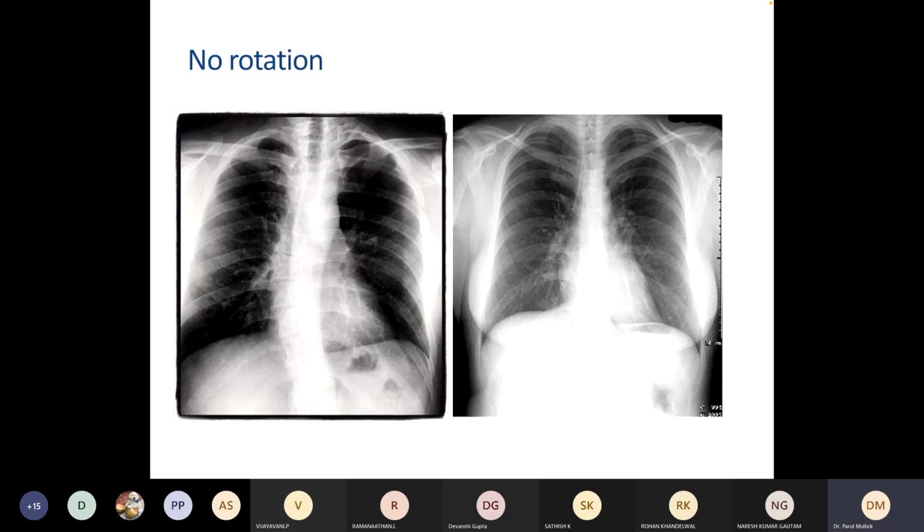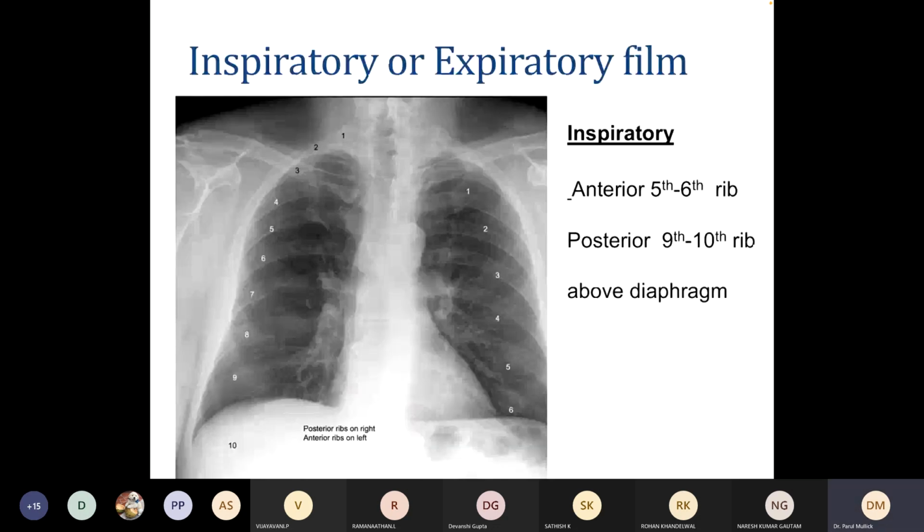Okay, now in this film you see, इस फिल्म में ये ऐसे appear तो rotated सा लग रहा है ना, टेढ़ा-मेढ़ा, but this is actually there is a spine deformity in this. Right? This is not a rotated film, but because of the spine deformity, it is appearing so. So this is what you have to keep in mind, that there can be a spine deformity. तो आप इसको midline से tips को देखो, because as such देखो तो आपको लग रहा है ये क्या घुमा हुआ है, but it is not so. Both are not rotated films.